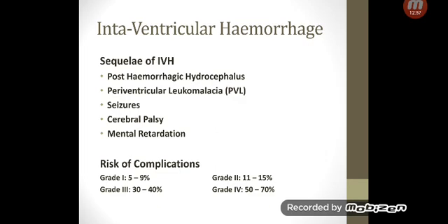So even if you can't be sure with your screening which grade is there, and you think it's enough to say there's a hemorrhage, which is really enough as well, because basically you're going to escalate to a CT at that point, which is going to be justifiable. But it's also important to understand the grade, because maybe with grade 1 you don't need to do anything. You don't even need to go to CT, but you need to follow up or get a radiographer to follow up for you.